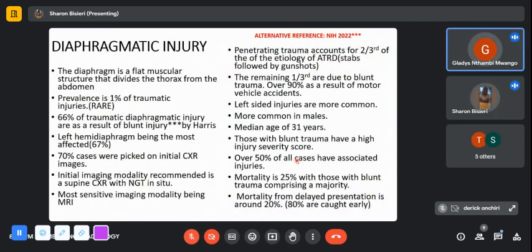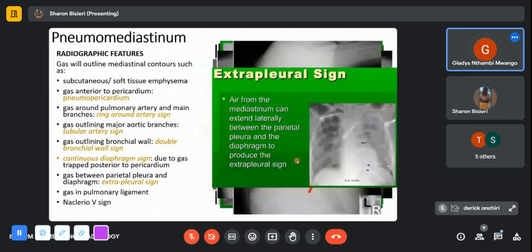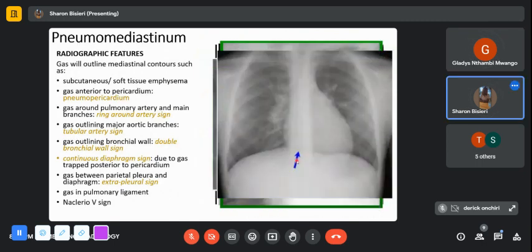Just go back a bit. How did you see the continuous diaphragm sign? Okay, fine. Yeah, it's okay. I just need to revise what's in my mind. Okay, let's continue, about the esophageal tears. Yeah, I was just trying to reason.